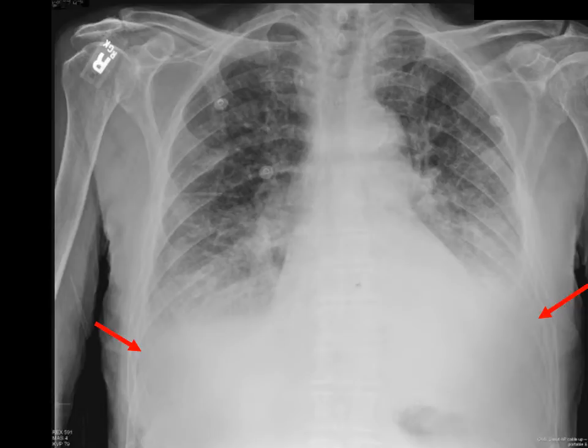Pleural effusion is oedematous fluid that builds up at the bases of the lungs, starting with the costophrenic angles, which are indicated by the red arrows in this diagram. Pleural effusions may not be present in mild pulmonary edema. When present, right-sided effusions usually precede left-sided effusions.